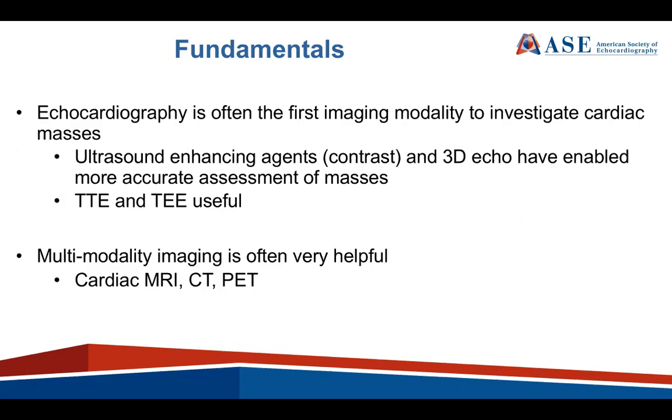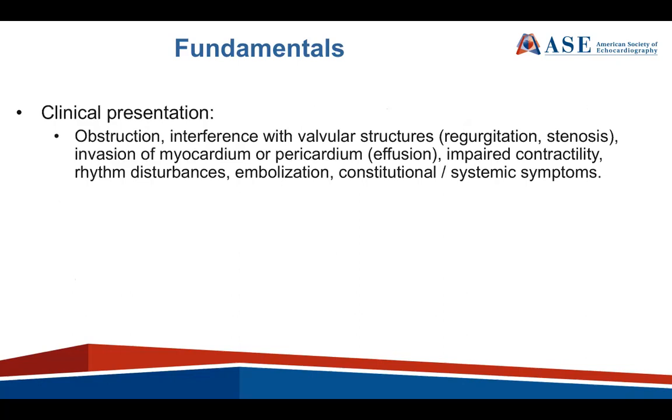Now, the fundamentals a little bit on this. Echocardiography, as we all know, is often the first imaging modality to investigate cardiac masses. We often use ultrasound enhancing agents, also known as contrast, and 3D echo in recent years, that have really enabled more accurate assessment of masses. We also have now transillumination technologies that can help characterize these masses as well. Both transthoracic and transesophageal echocardiogram are helpful, but we do invoke in these days multimodality imaging, especially with cardiac MRI, CT, and PET.